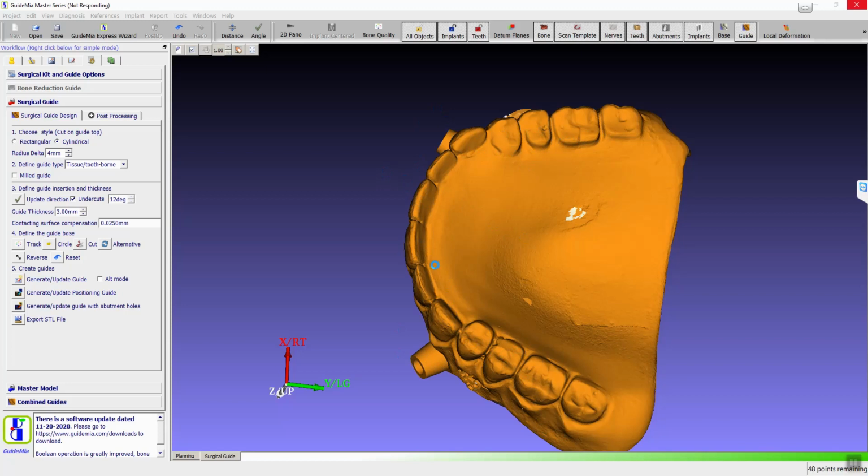Will it keep the anchor pins? Yes. That's our alignment. So basically, what you can do is use zirconia or whatever material to make this one with anchor pins, plug it into the mouth, then adjust.